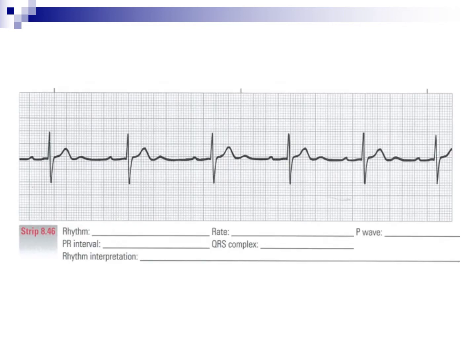On strip 846, this rhythm is actually considered irregular. It's kind of off by more than 2 boxes. So we're going to claim that heart rate to be 40. Again, if you're doing the 6 seconds, you're going between these 2 markers and you're only counting the R waves. So this R wave does not count.